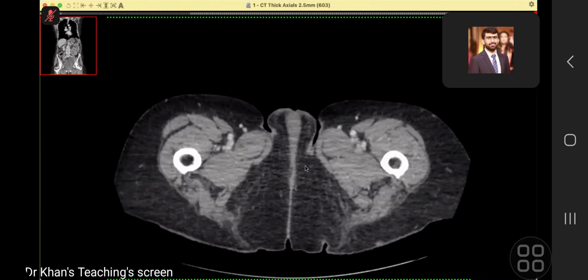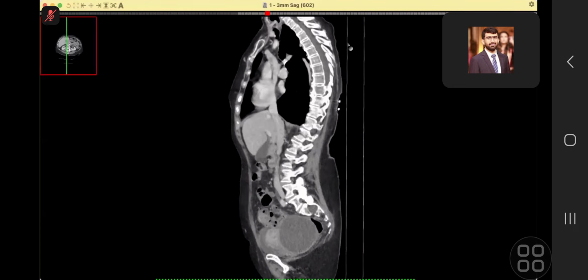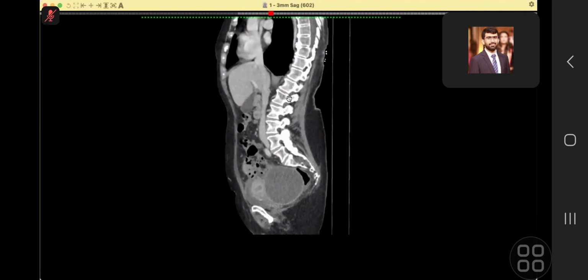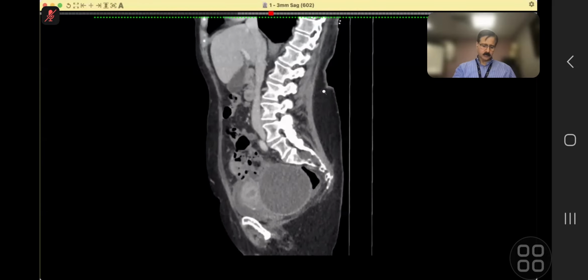Sir, can I get the sagittal images? Over to you.